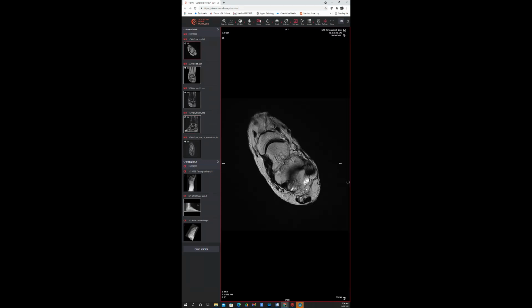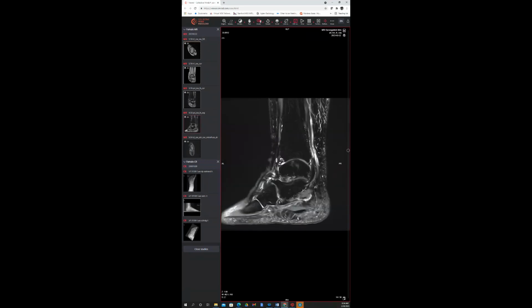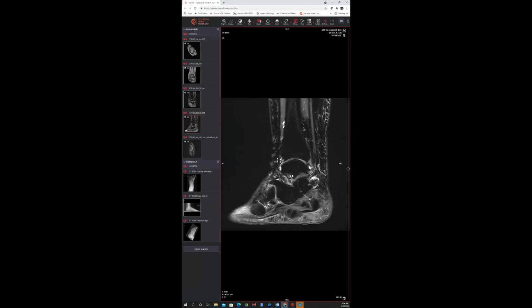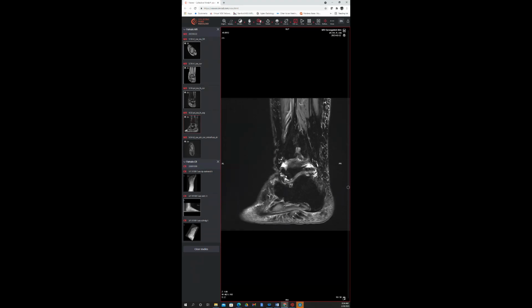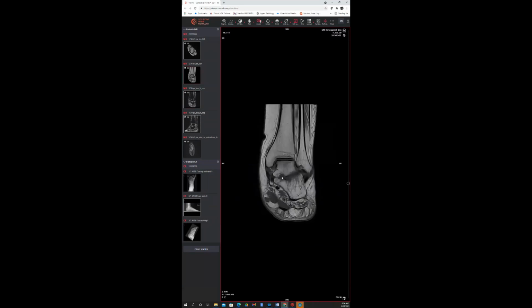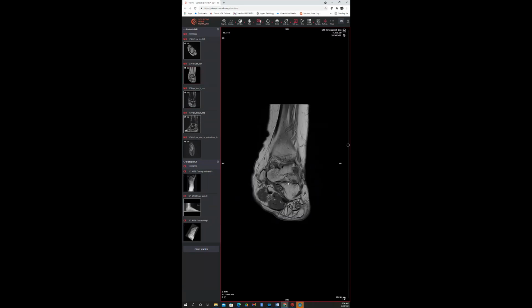Let's get a better look of that on the axial image where we can see this chronic tendinopathic change in the Achilles. Looking at the bony structures, we're seeing that there is subchondral edema, grade 2 diffuse chondral thinning along the lateral talar dome. We can see that we have the subtalar, posterior subtalar joint, advanced degenerative change along the lateral talar process, which makes sense when we consider the altered biomechanics that are occurring here. Sinus tarsi itself has some obliteration of the fat space here. Let's take a look in here. Some synovitis, some mild preservation.